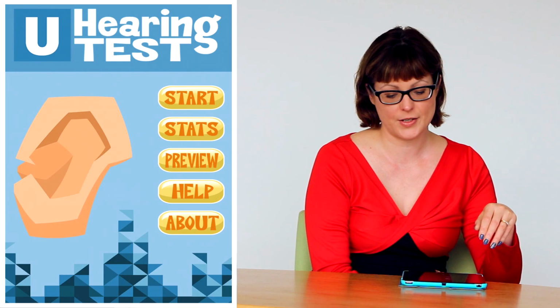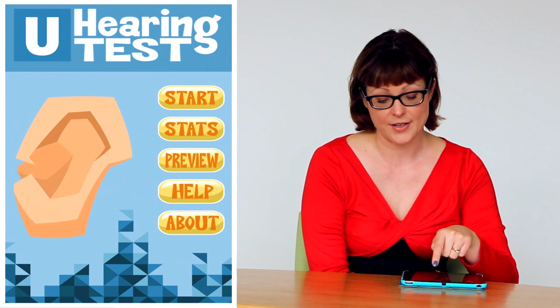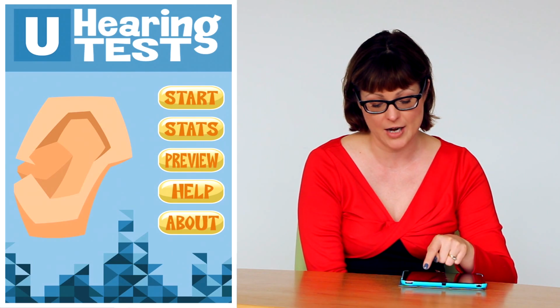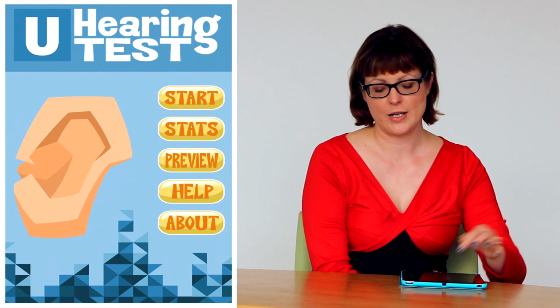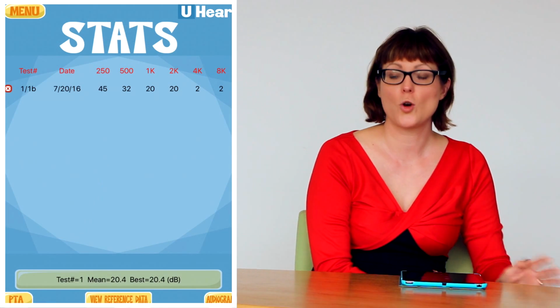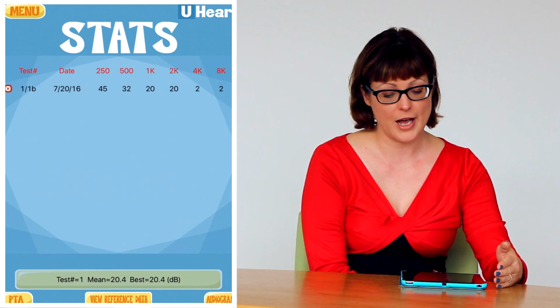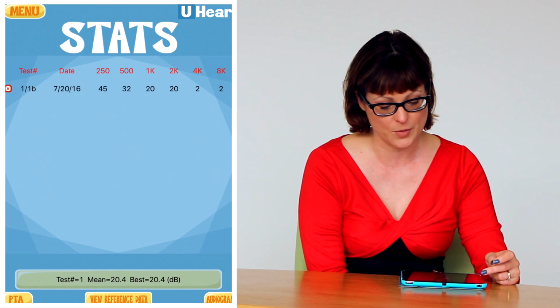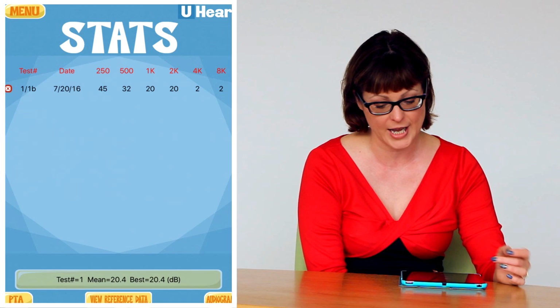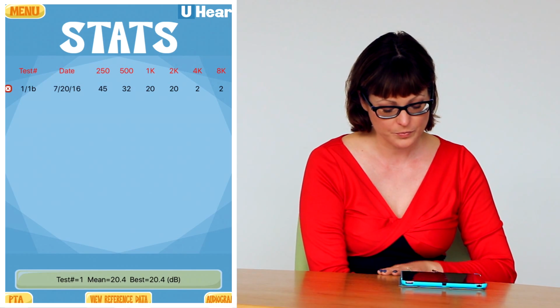The hearing test can be used by different people, and you get some stats, which are the results of the hearing test. It's just short for statistics. If I go back to the home screen and press stats, there's a couple of screens in there which you need to be familiar with. You might see this screen here, the blue screen, which tells you what number test has been completed on what date. So we've got some results here from another activity we did.